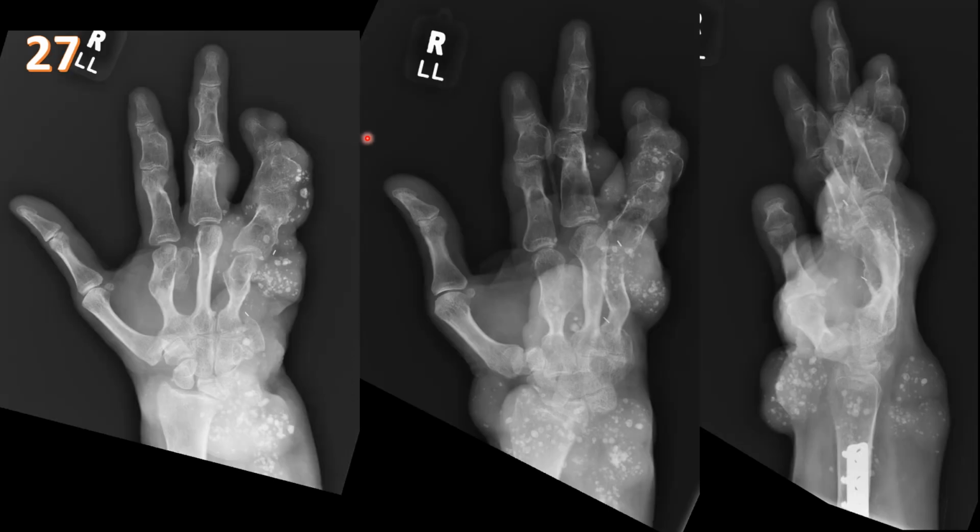Here we have a patient with multiple views of the right hand, and we see that there are multiple expansile osseous lesions throughout the phalanges and metacarpal bones. Similar to the prior case, these lesions have endosteal scalloping and expansion, and some of them have punctate matrix inside the lesion. Again, this is a person with multiple enchondromas throughout the body, a type of enchondromatosis, but we also see all these soft tissue lesions giving this bumpy appearance, and with multiple phleboliths all around the hand and wrist. So these are multiple soft tissue hemangiomas.